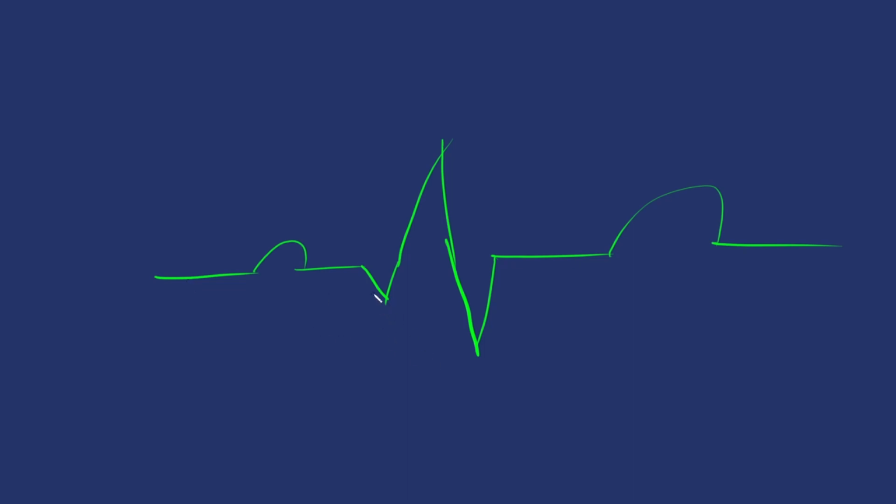Whenever you hear interval, it starts at the beginning of whatever you're reading. So if you hear PR interval, these are starting at the P. Going P to R, even though, again, it's confusing, it's starting at the Q, not the R. So this measurement from the start of the P to the start of our QRS is our PR interval. I'm going to do this as PRI.